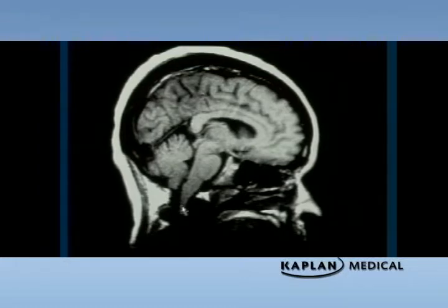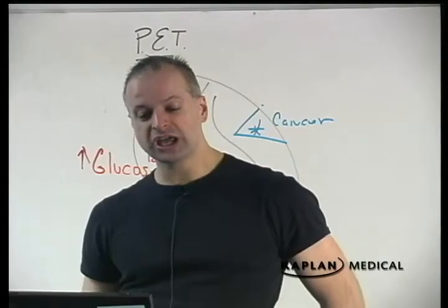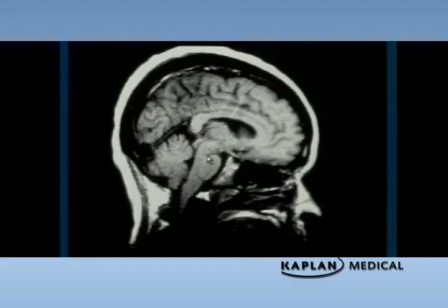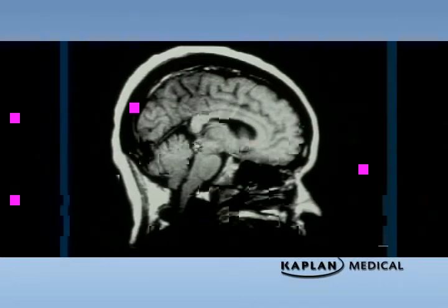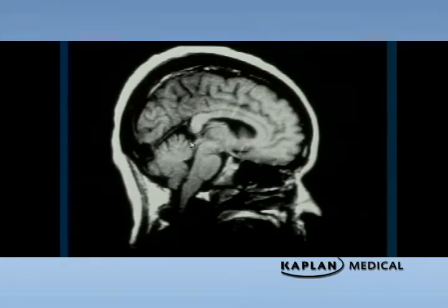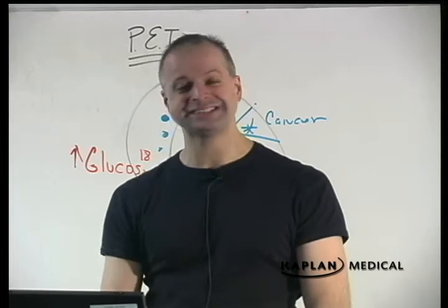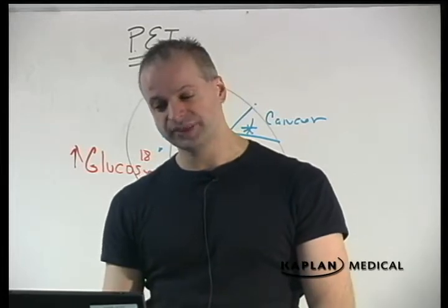This shows you that the MRI is superior for looking at the posterior fossa. The MRI is superior for looking at the brainstem. The MRI is superior for looking for cancers, for abscesses, infections. The MRI is superior for looking for everything except blood. When you're looking for blood, the best thing is a CAT scan without contrast.